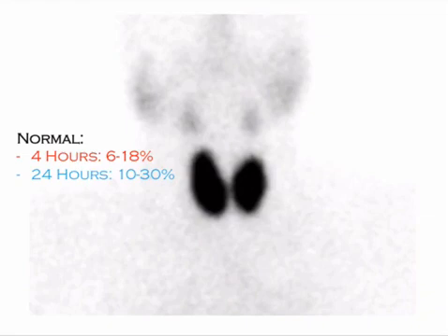And what's done is a correction, if they would happen to ask, just for completeness, is that background counts are corrected for using the thigh and neck counts for background. But just remember 4 hours and 24 hours, around 15 and around 30. It's how I remember it, to double it.